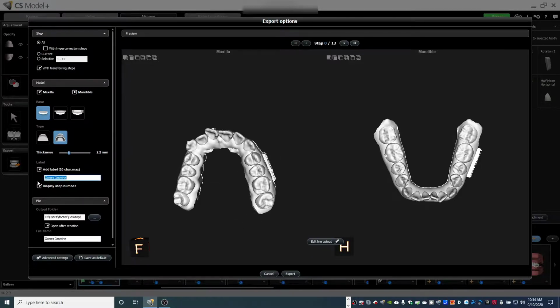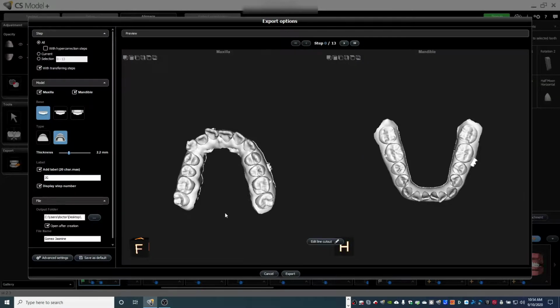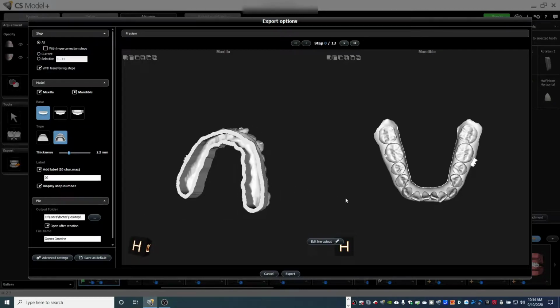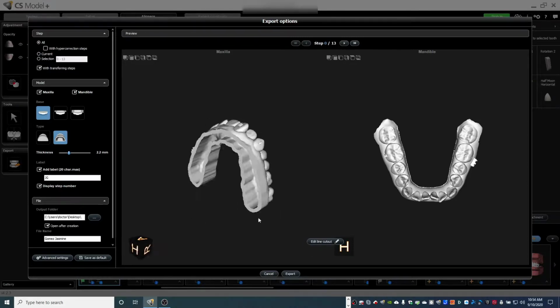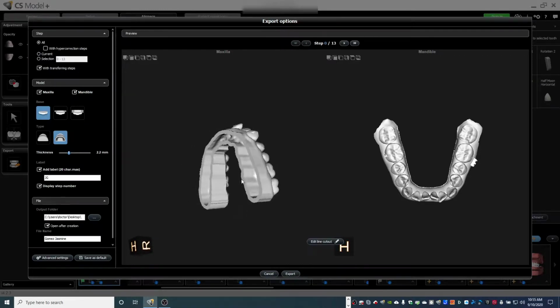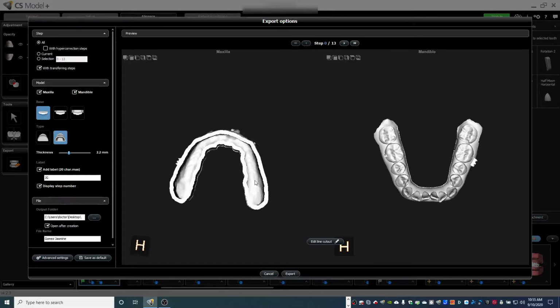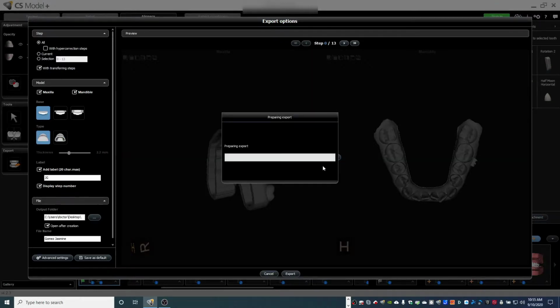What I'll usually do, for HIPAA purposes and so that I can dispose of these when the time comes, is just use the patient initials, so then I don't have to spend a lot of time obliterating their name to protect their privacy. So you can print these models hollow, or you can print them fully solid. I very rarely will do the hollow models. The pressure you generate from thermoforming, I think, risks the aligners not fitting, getting some distortion, and I find that I don't save that much resin when I'm hollow, so I'll usually do a solid model.